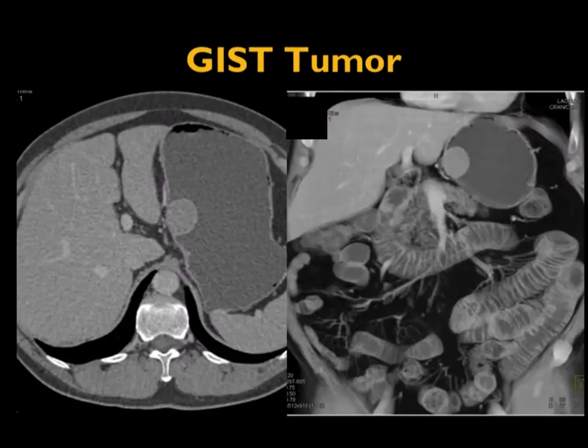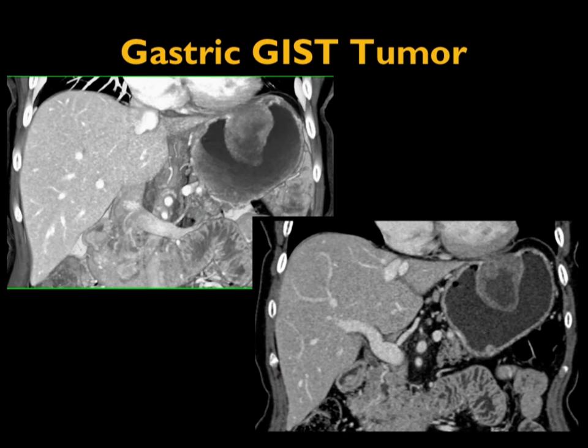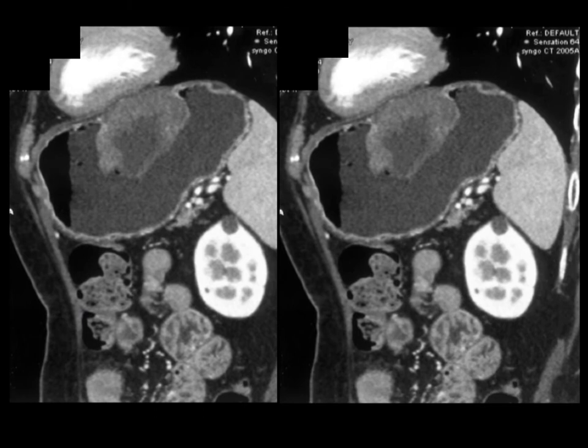So, for example, a smooth tumor in the stomach, a well-defined GIST tumor. You can see in this case it is intraluminal. And you can see in this case it's intraluminal as well, but it's a large, bulky lesion. It's much larger than the prior study, and you could see it on the 3D views. So GIST tumors can be large, polypoid, irregular enhancing lesions, in a sense hanging out in the stomach. You can see the necrosis in this case. You can see the ulceration. Now, this is, in our experience, the least common appearance.